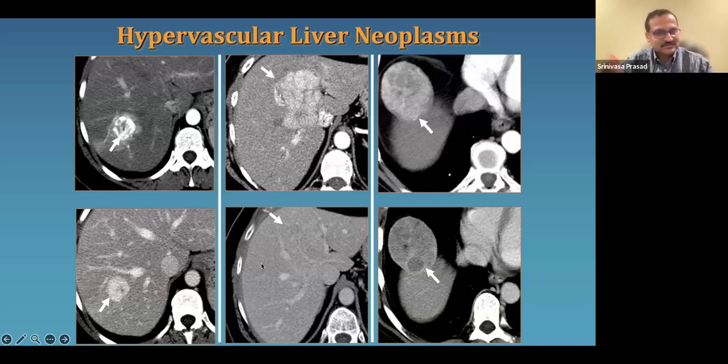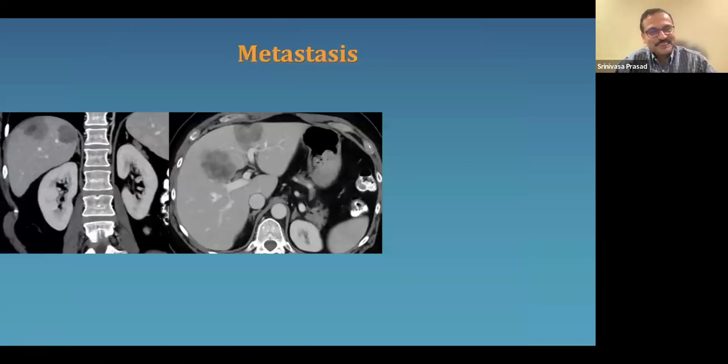dense, or if it was an MR, it becomes hypointense to that of the adjacent liver. This is a focal nodular hyperplasia. You see an exophytic, heterogeneously enhancing hypervascular mass. There is a significant washout, and this patient had cirrhosis. So hemangioma, FNH, HCC. If you get these things right, it is more likely that this lecture has been useful.